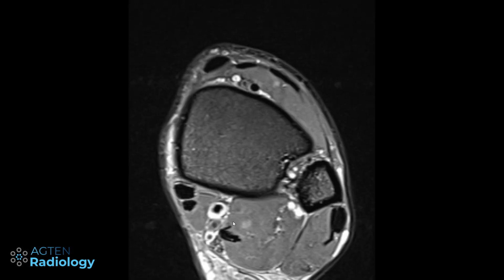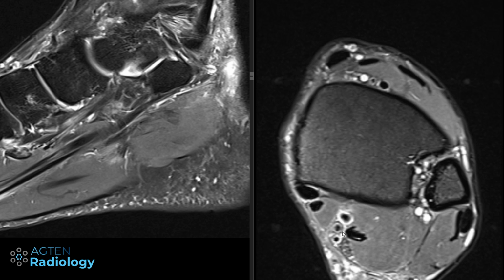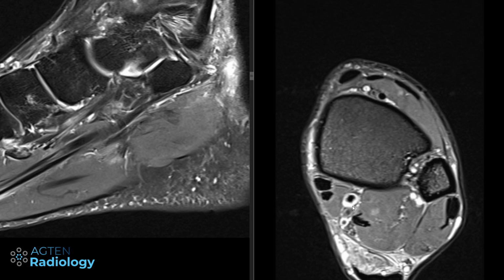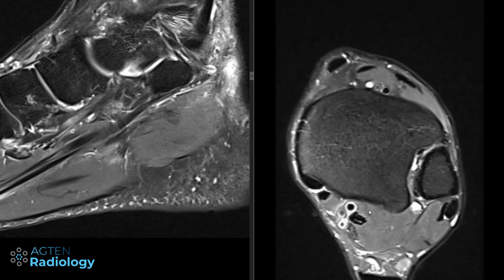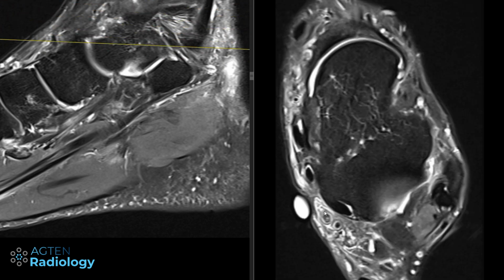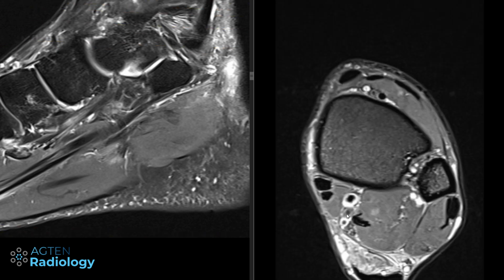So we can see here, let me go here, maybe we do even side by side, which should be good. So we can see here we are at the tarsal tunnel level. We have the vein, artery in the middle. There is some high signal now in there, and the question is now, is this flow void or is this thrombosis? Sometimes this is not so easy. It depends a bit on how everything else looks, whether there is edema, etc. I'm not quite sure, but here it kind of looks different. And I think this one here is already also thrombus, and this is the flow void in the artery. So we don't mistake the artery flow void for thrombosis.